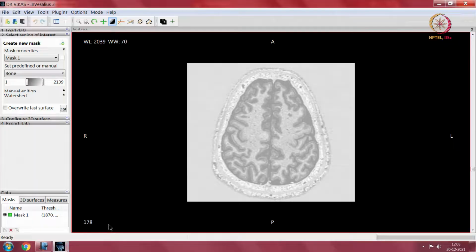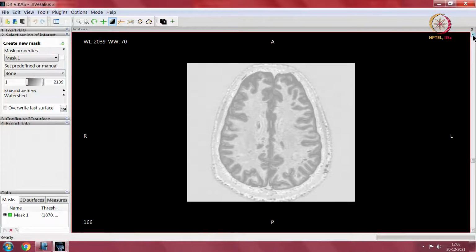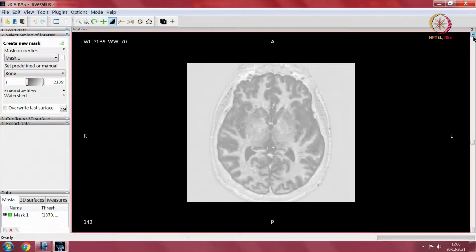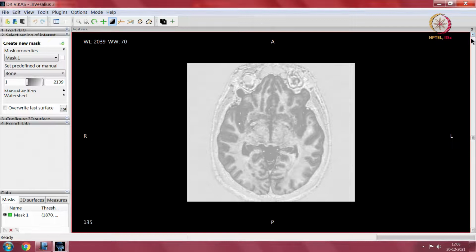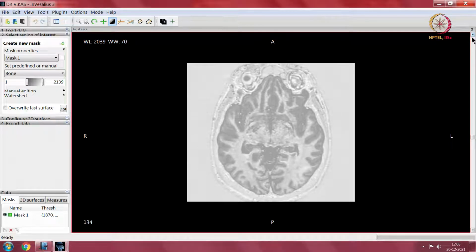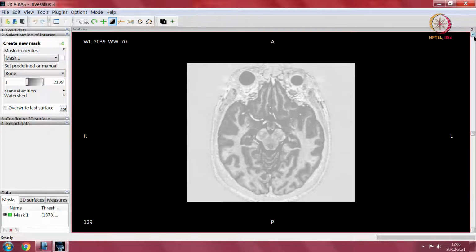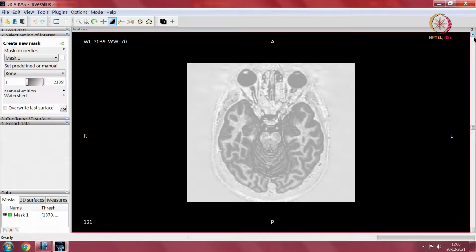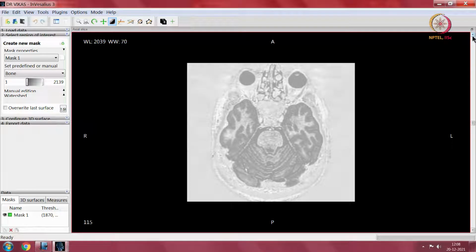We will come back to our topic. I am not teaching MR imaging over here, I am teaching anatomy. We will start with some basic notions. This is a T1 sequence. It is actually not a complete T1, it is called a highly weighted T1 with a specific purpose. It is designed to give you an idea of gray and white matter tissue.